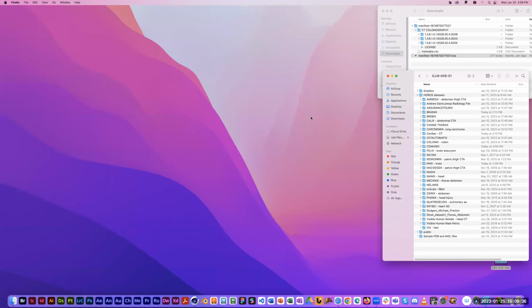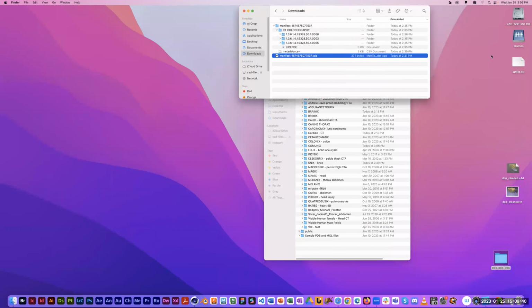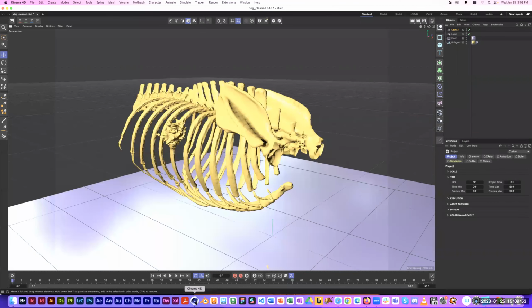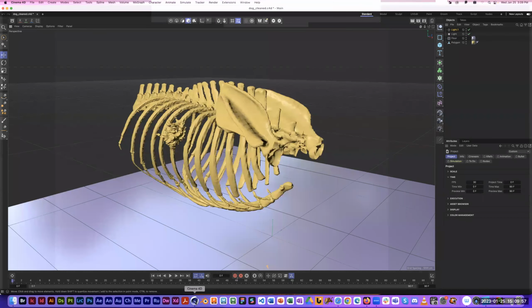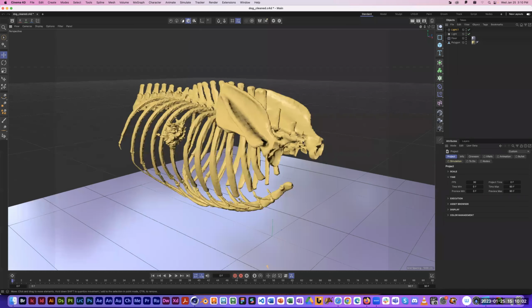It's going to temporarily hide Horos. So there's something just called 3dfile.stl, which I could bring into a 3D program. But I went ahead and preloaded something to show you. So here's Maxon Cinema 4D, which is really the only 3D program that I dabble in a little bit. And this is an export that I did from this dog thorax.